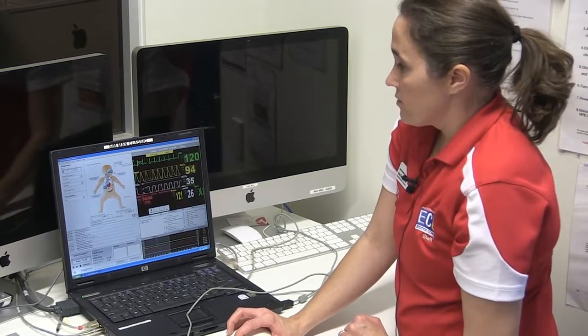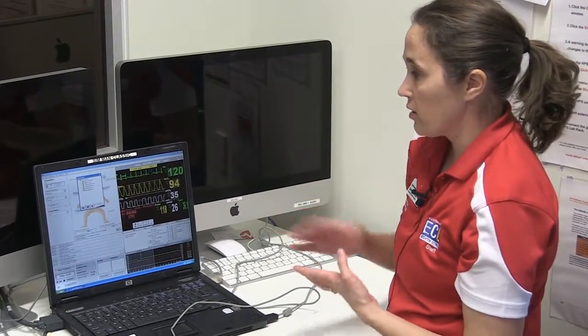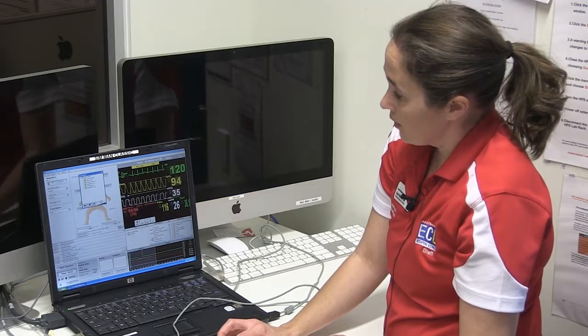Going into vocal sounds, you can choose baby cry, content baby, cough infant, cry infant, which is a little bit louder cry, and then a hiccuping baby. And again, you can adjust the volume as needed here, up or down.